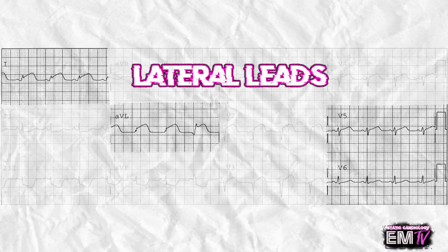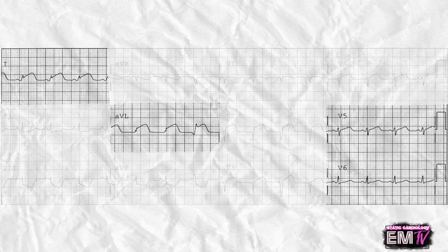The final group of contiguous leads is the lateral. In my lateral leads 1, AVL, V5, and V6, I'm seeing ST segment elevation present in lead 1 and lead AVL. V5 and V6 are fairly benign.